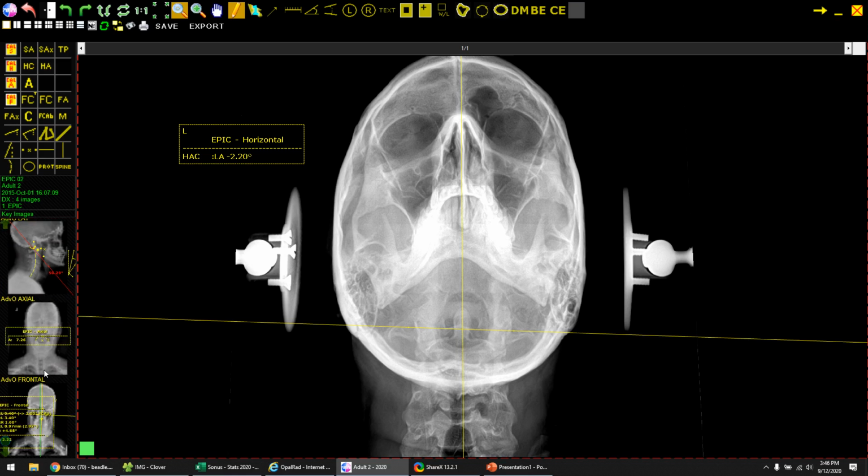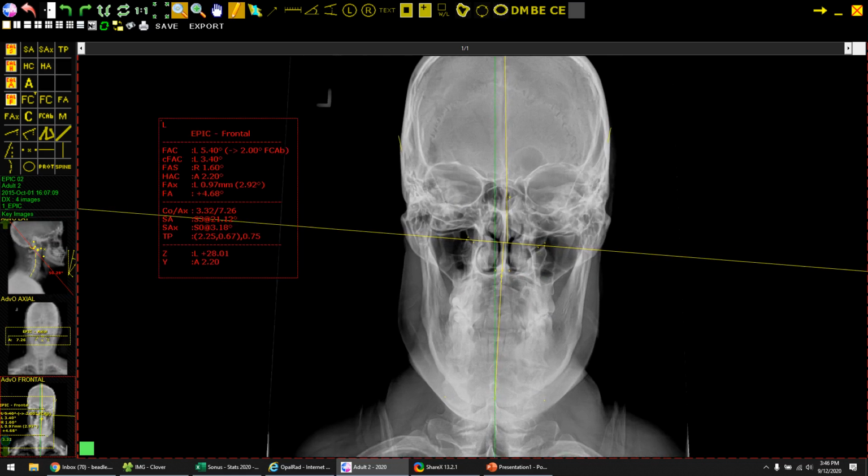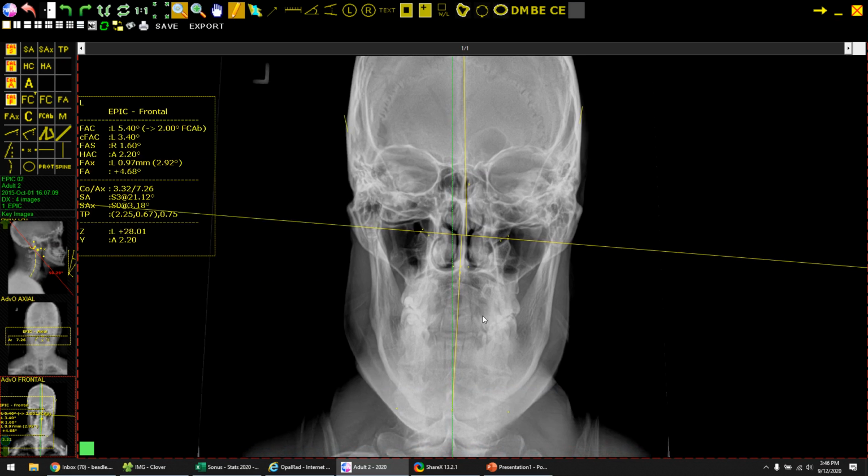All right, so then the last one. There's a lot of stuff that we're looking at with this one. It could be a little overwhelming. The overall design is that we're looking at the line that goes through the skull, the line that describes where the atlas is, and then a line that also describes where the neural canal is. And how we're describing the neural canal is we use C7 as kind of our base, and then the dens of C2, we bisect that, and then we have the spinous process of C2.